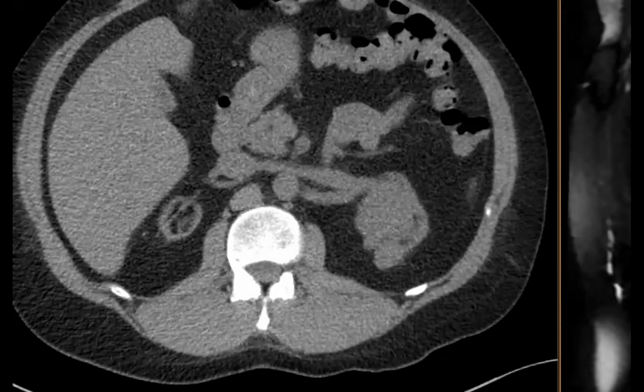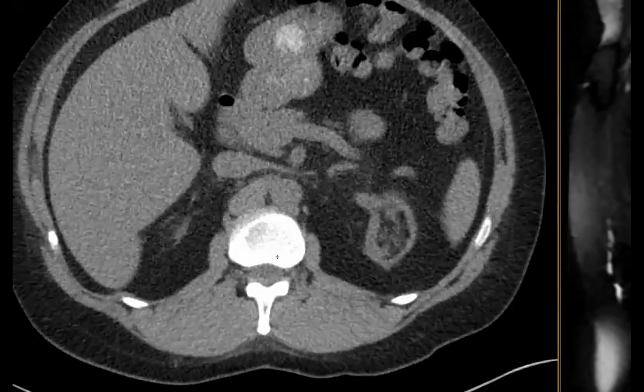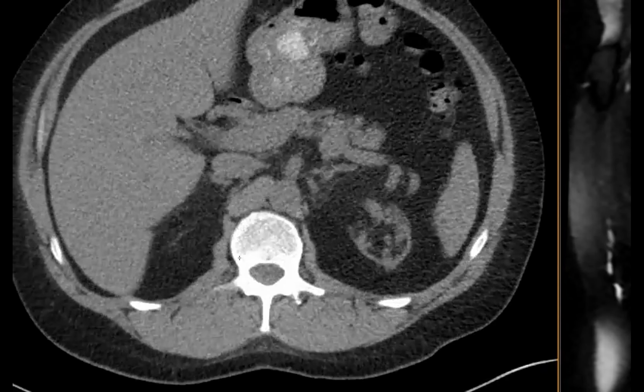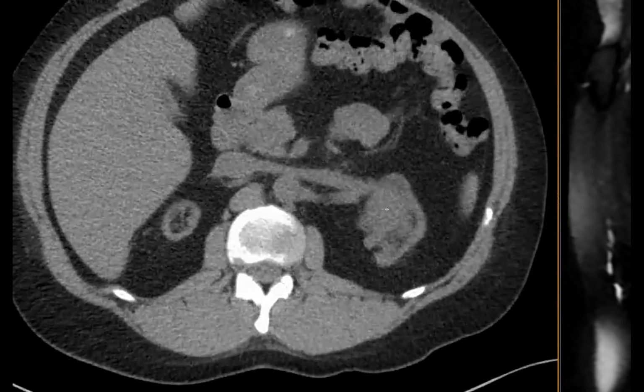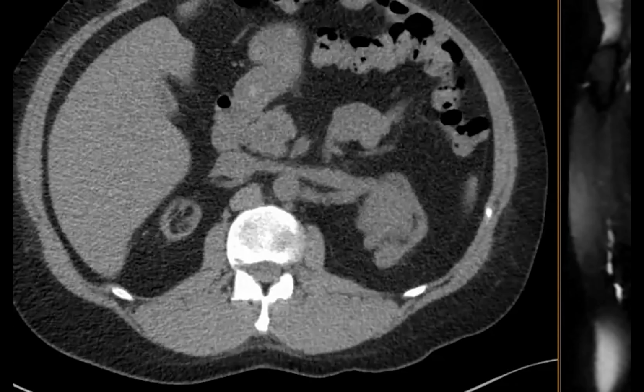Okay, Anu. All right. So this is a youngish person. And as you can see, one kidney is atrophic. This was a chest CT because they came in with pneumonia. And then incidentally, they found this mass, just the upper cuts of the kidney, no contrast. And so they were sent to an MRI to characterize this left renal mass better. So it was a great pickup on this non-contrast chest CT.